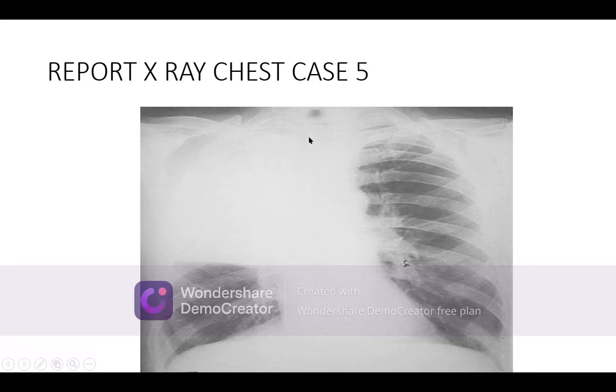Take your central, I always said it, and then we will report and compare the lung fields are divided here at the second rib, straight line, at the fourth rib, straight line, cutting there. So upper, lower, and middle, right lung, upper, middle, and lower left lung field. There are 6 lung fields.